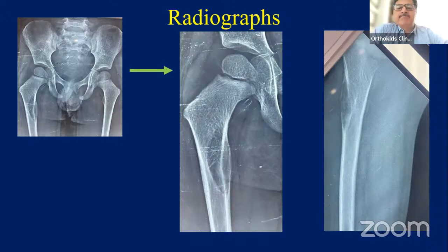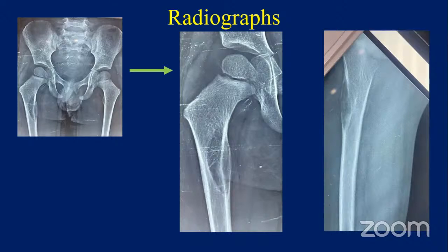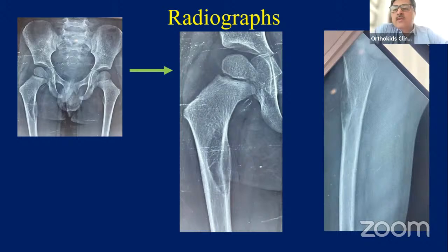So this is primarily a cortical lesion, and that is where you can narrow down your differentials. That's what you say based on the lateral X-ray, I think, because on AP it looks like it is going in, but there is a shadow. Let's go on to MRI and Joyance, what we thought primarily as possibility in this case.